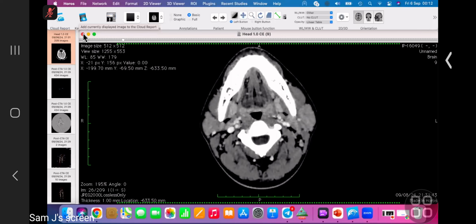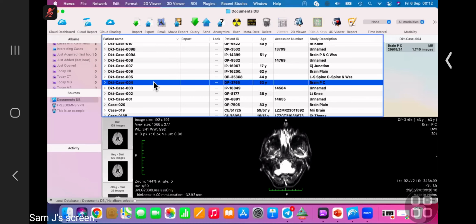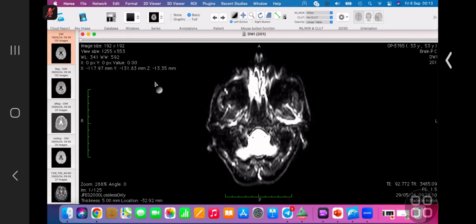Okay, candidate 2, thank you. I showed you 3 cases. We'll move on to candidate 3. Hello, hi. Can you hear me? Yes, I can hear you. Okay, thank you. So this is your case, case 4. You can request for a control. If not, I'll scroll. I will try to request remote control.